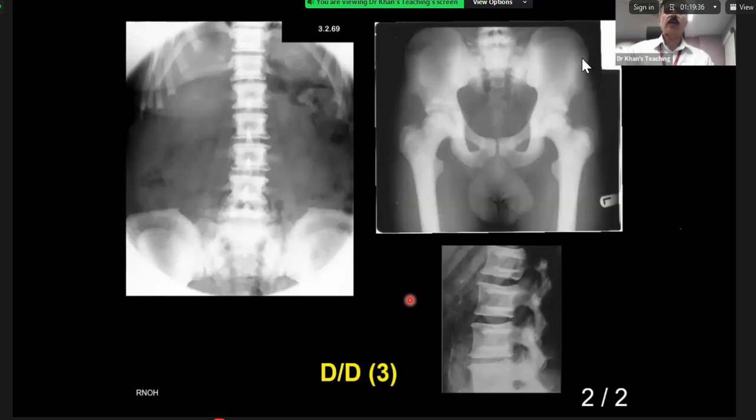But this particular sign gives you some leeway to diagnose it. The cyclic pattern will give you normal bone density versus sclerotic bone density at particular parts of anatomy. You will get this bone within bone appearance in the vertebrae like this. You can get lucencies at the metaphyses which are perpendicular to the long axis of the metaphysis.